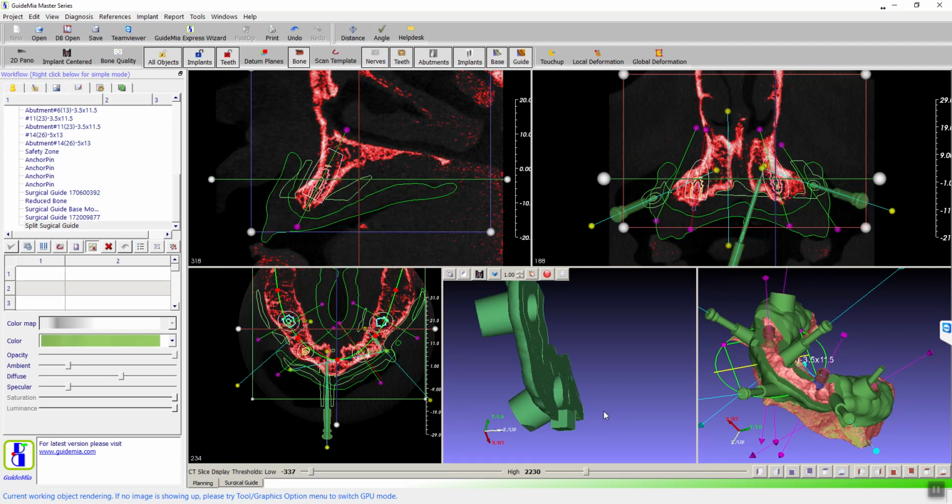I think we have like 100 microns clearance. Some printers may be accurate enough, but some may not be able to take that. So for your case, I think the printer is very accurate. We can reduce that clearance.